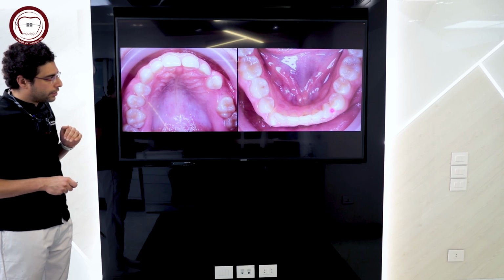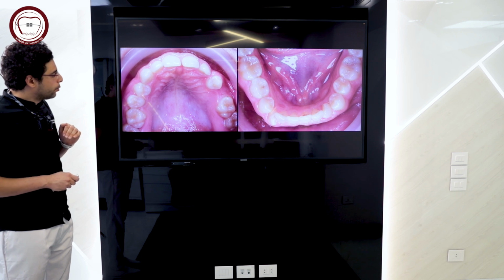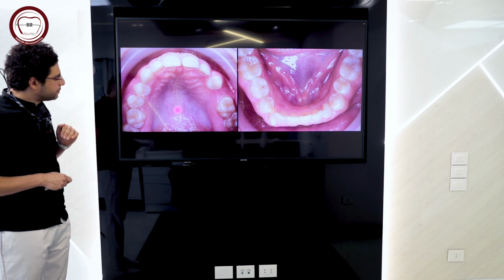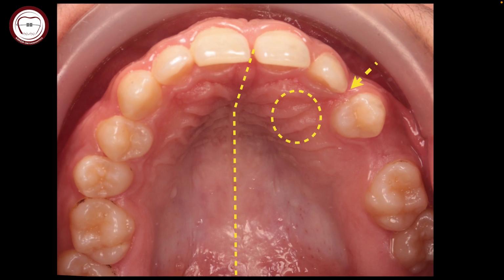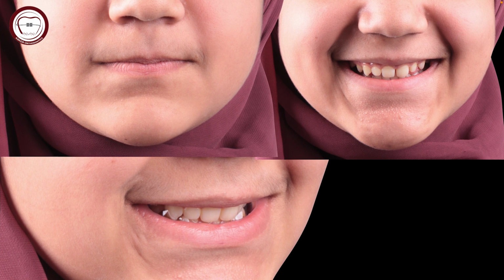Two rotated lower canines and retained second primary molars here. So now we also need to correct this midline shift. It's an obvious 3 mm midline shift for that patient. So little space for the upper canine, midline shift and bulging here indicate palatal impaction.